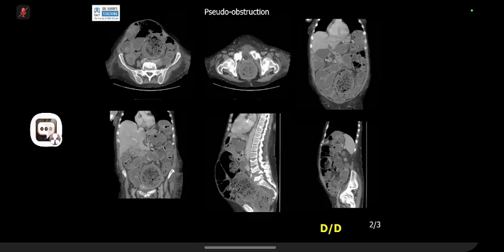If push comes to shove, ask for a CT scan. We used to do a lot of barium and gastrografin enemas. And the idea was, and initially it looks horrendous, but I have done quite a few myself, maybe 15, 20 years ago. You can actually manage for the gastrografin to go all the way to the cecum, and then you get that. Now we don't teach that because we have got CT, right? And so in CT, you can trace everything and look at these measurements. They are horrendous. Please remember a disclaimer.